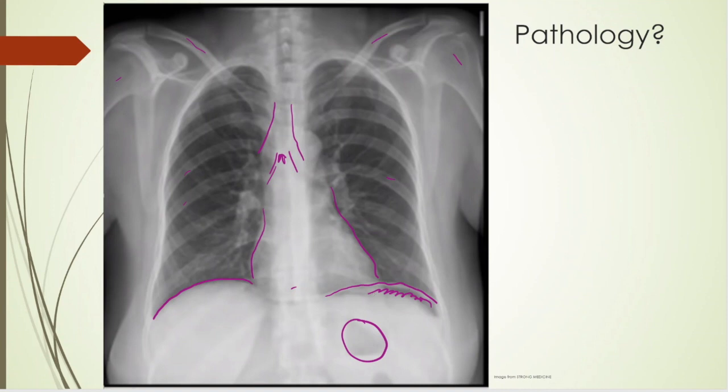So go on to E for everything else. Has good lung markings all the way out. So I don't see a pneumothorax. No pneumonias we found, etc. But this patient does have a pneumoperitoneum and needs to visit with a general surgeon.